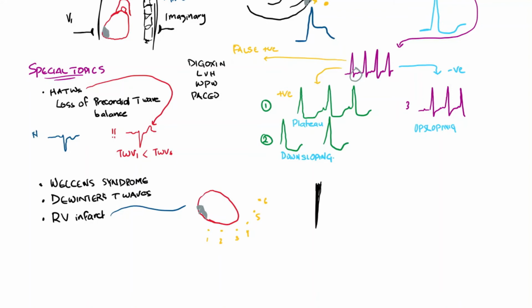Let's illustrate the sternum over here, and you can see the normal positioning of all the precordial leads from V1 to V6. If you are suspecting a right ventricular infarct, what you can do is you can just use right-sided leads. You can take up all the precordial leads and place them in a similar fashion as illustrated over here. So you take V1 like this, V2, V3, and all the way to V6 onto the right side of the chest. And this time, what tends to happen is that the anatomy of the leads is more or less towards the right side of the heart.